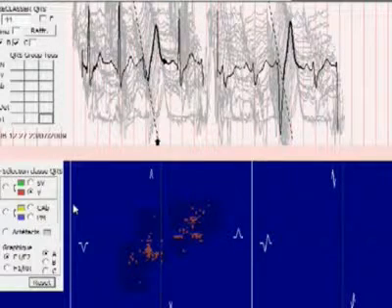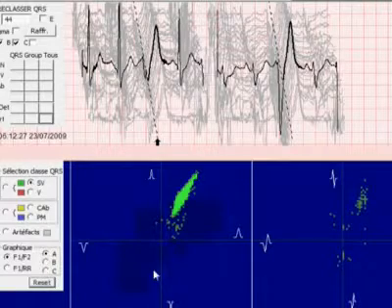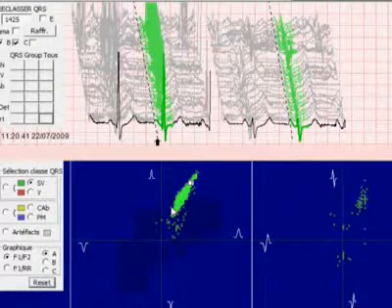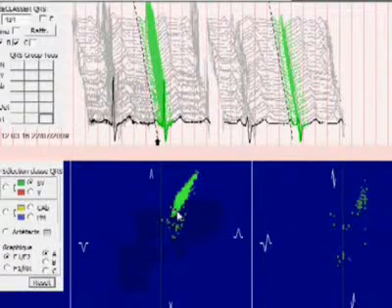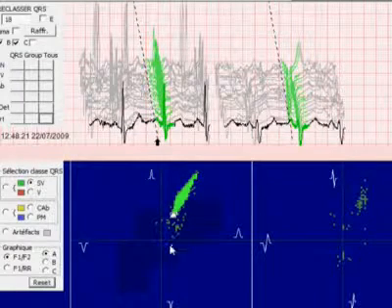Now select the supraventricular QRS. Only green dots remain. Drag a few green areas. You will be able to check the consistency of the QRS. The upper peak corresponds to higher range QRS, and the bottom peak corresponds to the QRS with less height. There are a series of green dots scattered beneath the cloud. The 3D screen shows that it is mostly ventricular QRS.